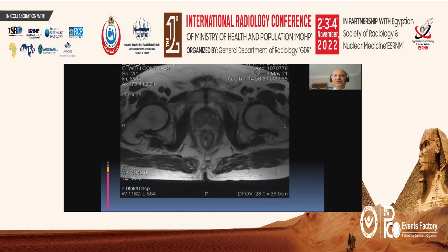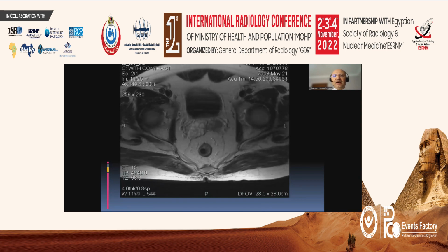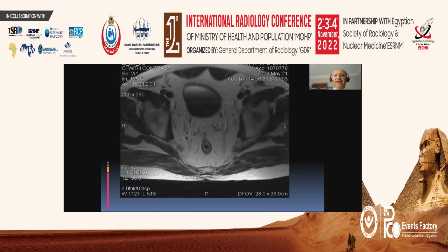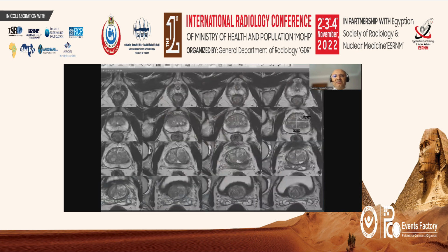What has changed in the recent years is that in the past, radiation oncologists were ordering this study. Now we have the urologists ordering the study. And you have to be aware that the localized tumor, which are T2 and T1 tumors, have a benign course. But if you start having seminal vesicle invasion, extraprostatic extension, or bladder invasion, the prognosis becomes dismal, and we can detect this. And this is our 3D MRI. You can see the anatomy, which is amazing, obtained routinely nowadays.